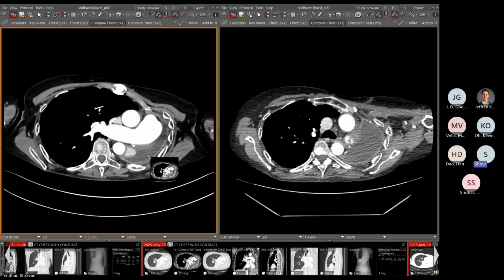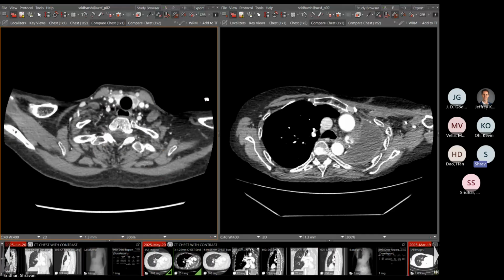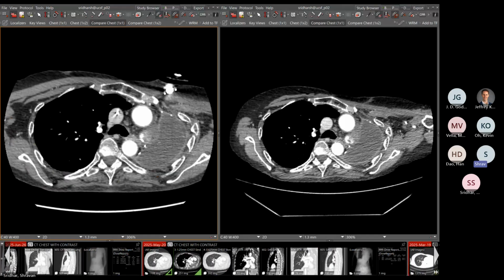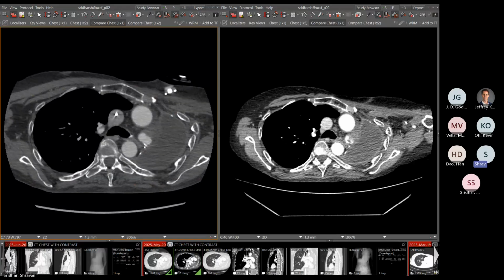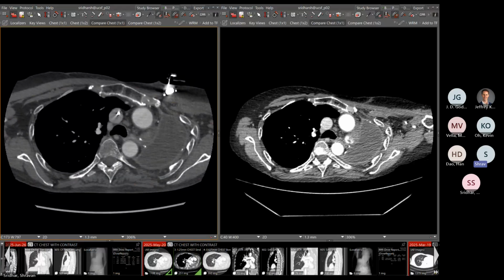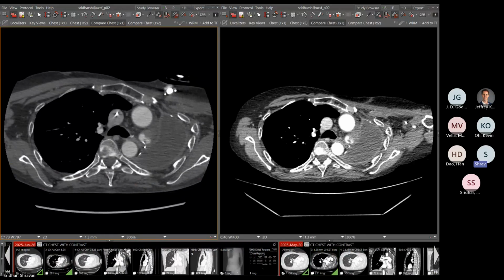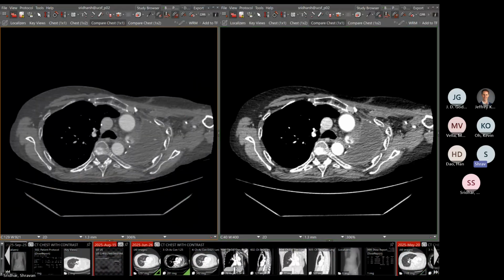And ordinarily I would park it, like write on the finding, and I would study that area very carefully, but it's a busy day. You're going through these cases pretty quickly. And so here you start to see in May of 2025 a tiny filling defect here, and maybe that catches your attention.